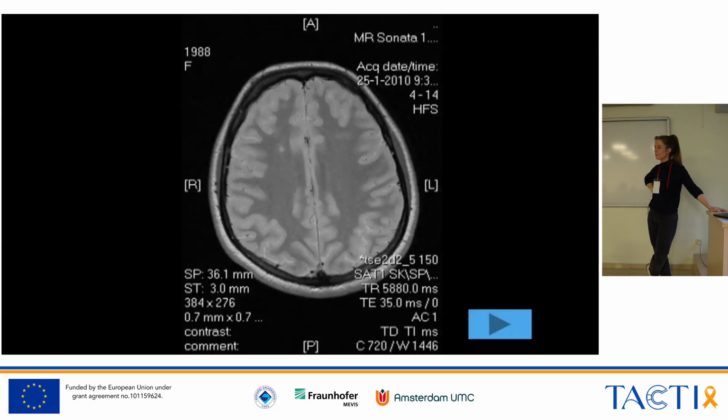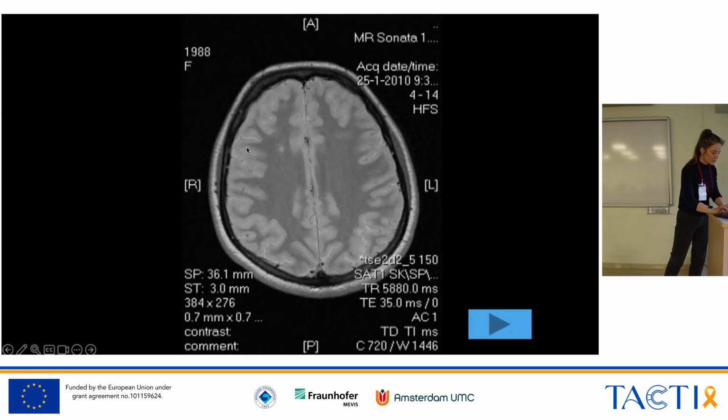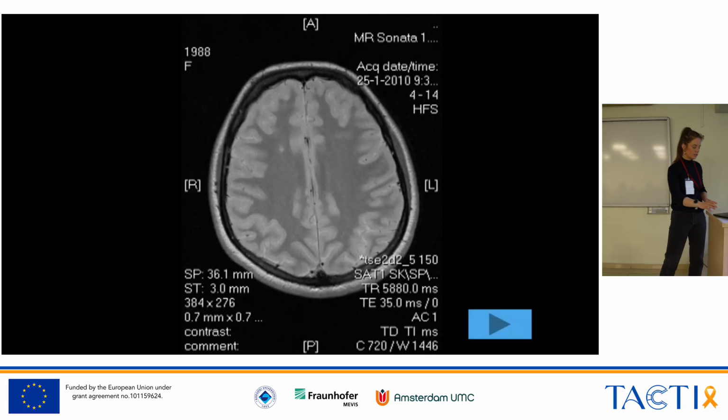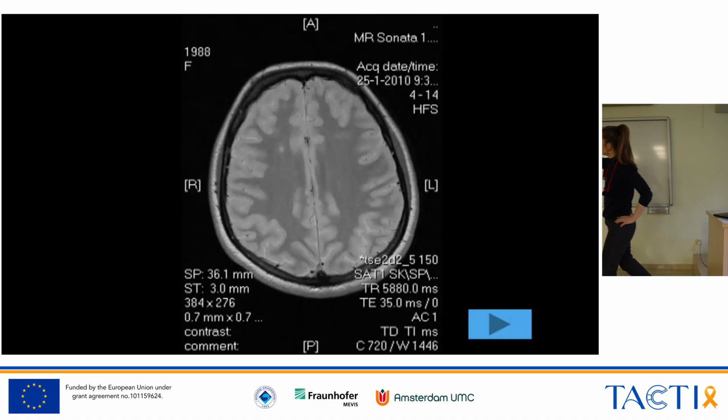Even if it's a young patient, if it's a migraine patient, you sometimes see it in young people also. Yeah. And how do you know it's a deep white matter lesion? That is because you see white matter surrounding the lesion and it doesn't touch the ventricle. In every direction. Yeah. So the every direction is actually a good remark, because you're not yet sure if the ventricle isn't right below it.